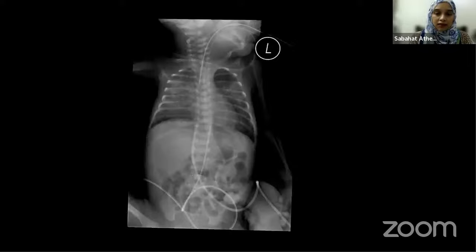Okay, let's go to the next case. What's happening here? As I said before as well, always in an X-ray, we should start with what? Pneumothorax. Okay, what else? Tubes, excellent. So what do you think of the tubes? What are the tubes here and what do you think, how are they? I will wait for this one because these are one of the very important ones.